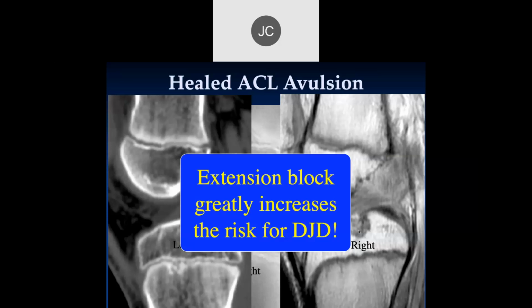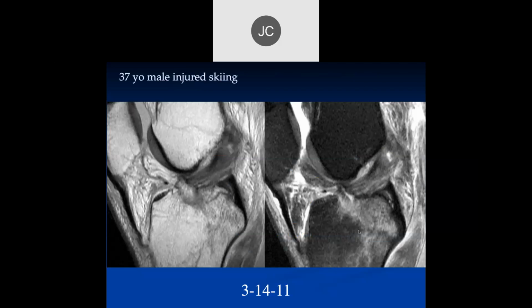I'm just showing a bunch of these because a lot of people don't see these because these are more in pediatric cases. And I just want you guys to see they can all look a little bit different and sometimes confusing. So I want you to see several different ones and what they look like.